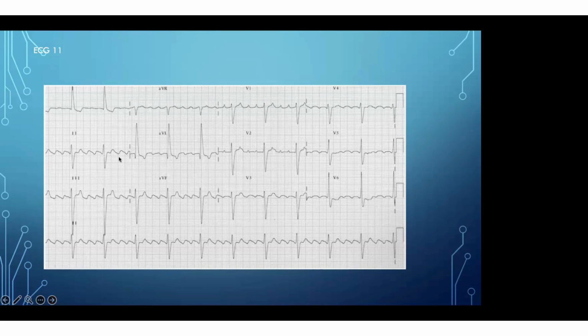Atrial flutter, correct. So atrial flutter, because you can see the sawtooth pattern in the P waves. Actually, how will you differentiate flutter from atrial tachycardia? Both have multiple P waves. P waves will be more than QRS. That is the catch in this. Atrial arrhythmia usually will have more P waves, 3 or 4, or sometimes 2 P waves for a QRS.